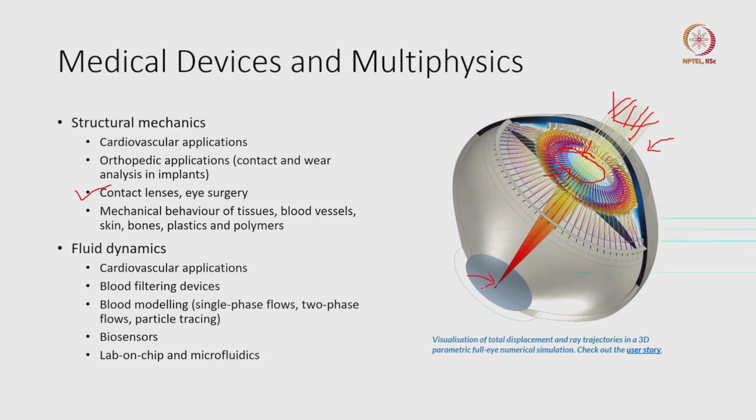This complete analysis includes the deformation of the lens material, and the rays propagating through the deformed lens and interacting with the retina. All of this can be modeled in a single interface, and that is the beauty of this tool.